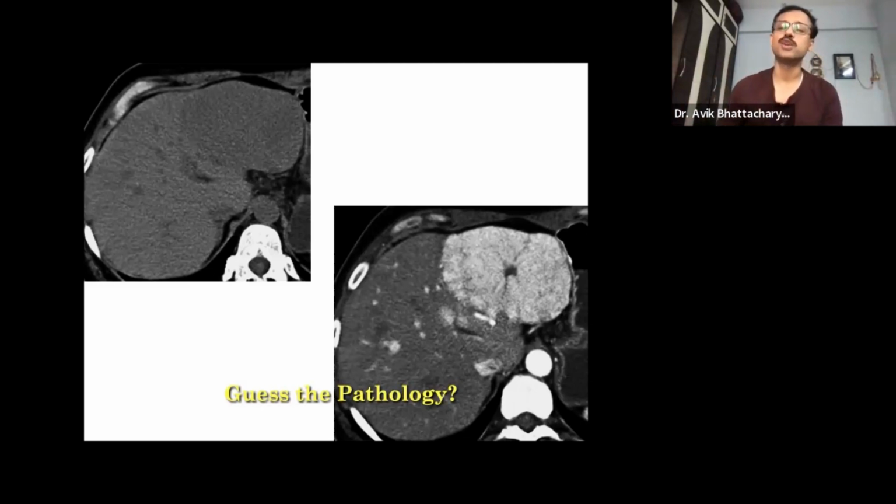In some cases of sclerosing hemangiomas, which are atypical hemangiomas, it will not follow the normal contrast enhancement characteristics. As it is a very common liver lesion, sometimes we see this type of lesion in cirrhotic liver as well. And if they are the sclerosing variety and not fitting the normal contrast enhancement criteria of a hemangioma, then we are stuck actually. Then we call them probably LR3 or LR4 lesions. We cannot differentiate those lesions from a lesion suspicious for HCC. That sclerosing variety of hemangioma would not have the typical contrast enhancement characteristic that is shown here.